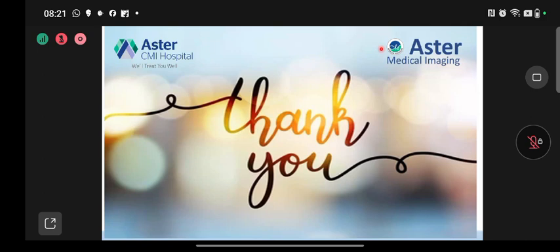Next question: is there any grading for washout? As such, there is no grading. You have to just look for two things. One is arterial phase hyperenhancement, the primary lesion with arterial phase hyperenhancement, enhancement relative to the background liver. In the venous phase, the background liver also tends to enhance. So whenever the lesion's enhancement becomes relatively lesser than the background liver, we consider it as washout.